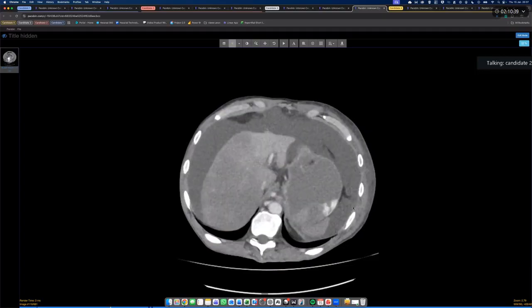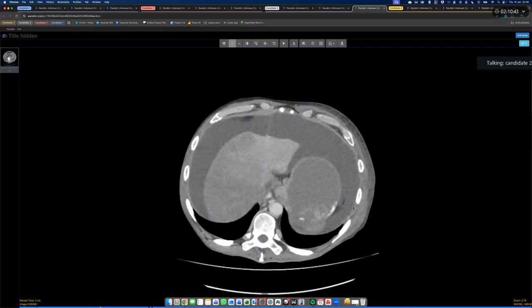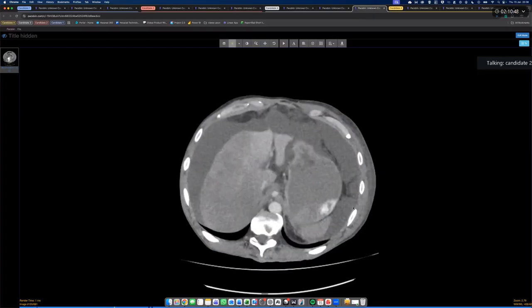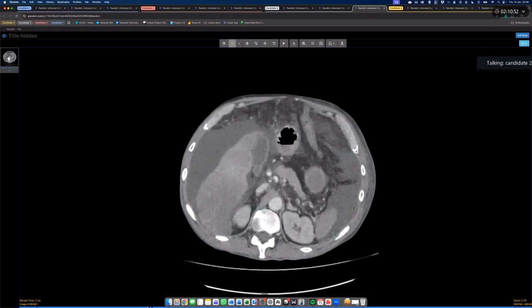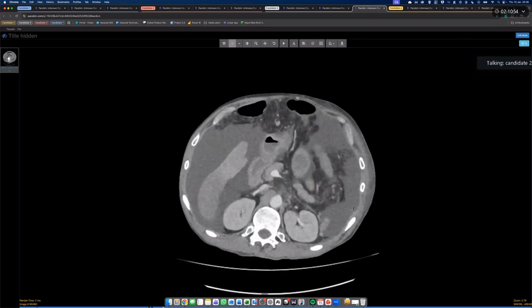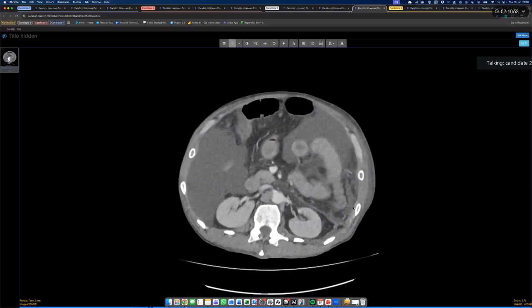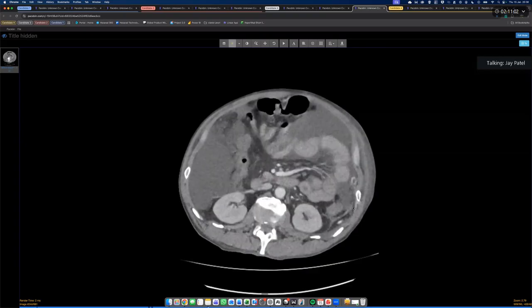Ideally, I should be looking at the arterial phase to look for any liver lesion and contrast extravasation from the liver or any ruptured lesion from there, if that's available. But since there is a lot of hematocrit level in the pelvis, that would be my top concern in this patient. What would you do?